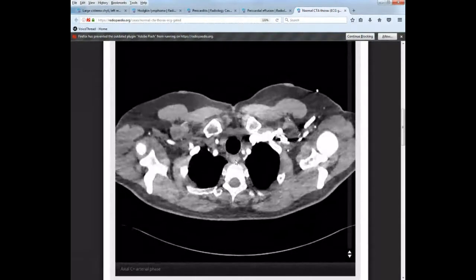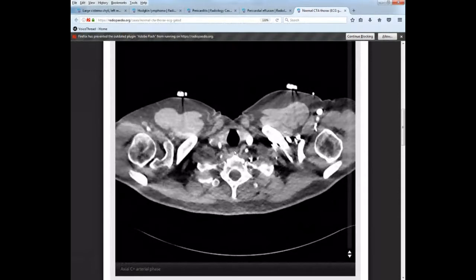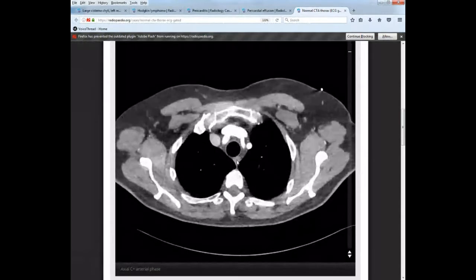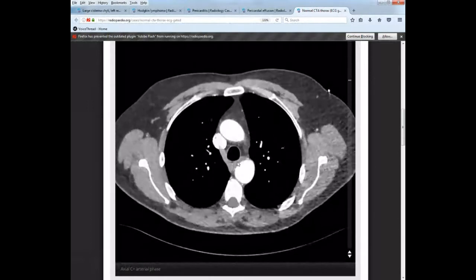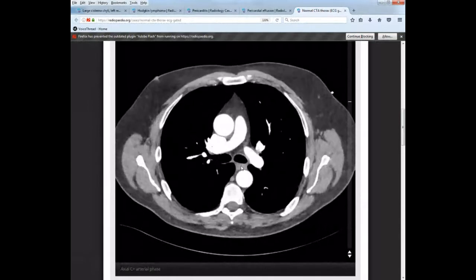There's a little bit more air all the way up, okay? So there's your esophagus. Start up, follow the trachea down, this density posterior to the trachea, and look for air pockets. You will see teeny air pockets in most patients. Okay, smushy little area there, a little bit of air.